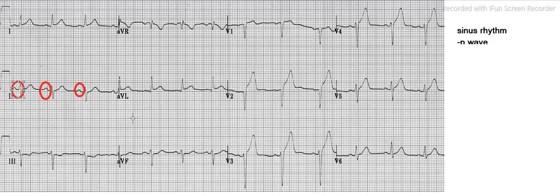And the other criterion is that every time the P wave comes ahead of the QRS. Suppose let's take this one. Here is a P wave, and this is QRS. Here is P, and this is QRS complex. Here is P, and here is QRS complex. Similarly, this is P QRS complex, this is P QRS complex, and similarly here, P QRS complex. So every time P is preceding the QRS complex. So that has also been fulfilled.